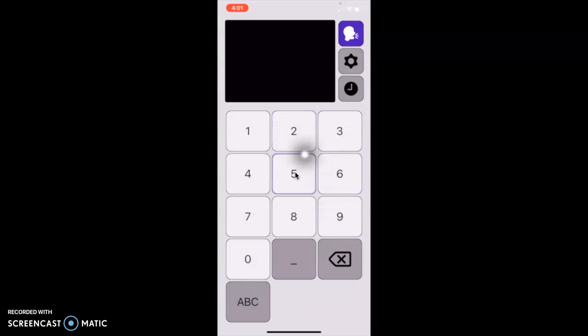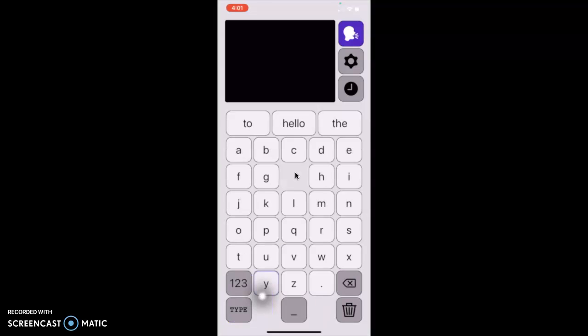While we're having a look here at this page with all the numbers, I thought it would be a really good time to inform you that this whole app is being controlled by my nose right now. So everything that I do, it focuses right on my nose, but I'm also able to use my fingers while doing it as well. The next feature I'm showing you here is the drawing feature. So you can go between letters while leaving the trail behind you, and it will put words together for you.